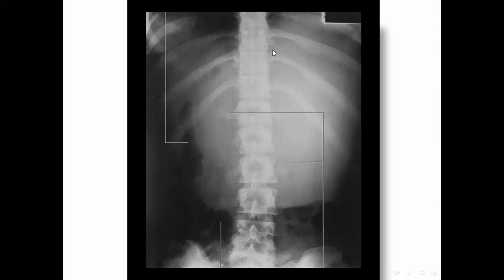Any soft tissue opacification coming from the left side and capped by the diaphragm, and the line of extension of the tumefaction, the axis, going to the right lower quadrant, is a spleen. So this is a large spleen, and usually such a large spleen is seen in lymphoma.